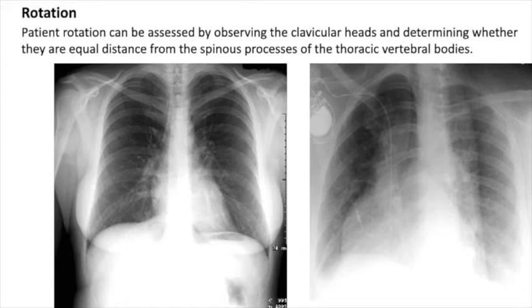Multiple doctors treat pneumonia or other kinds of disease thinking the X-ray is positive. But as a matter of fact, there was no good technique in the X-ray, and they don't know about that. So you have to be very careful with this. You have to know very well when the X-ray is done in the proper condition and with proper quality. It's very important to know that.